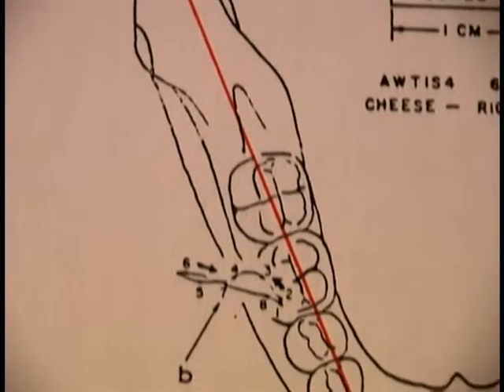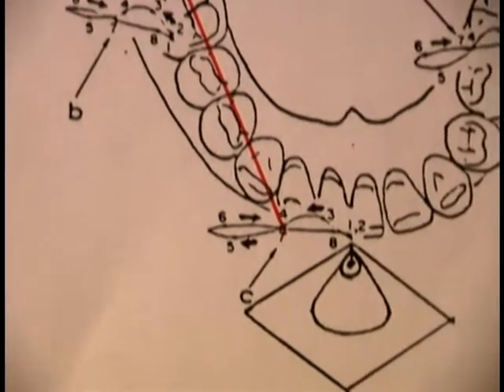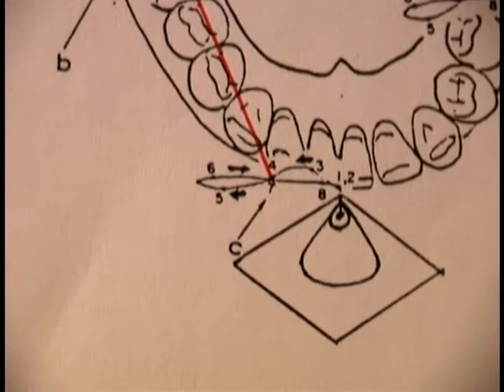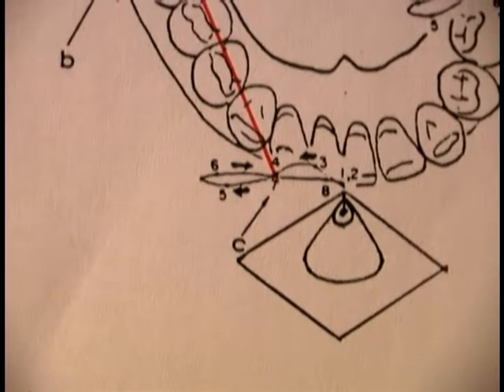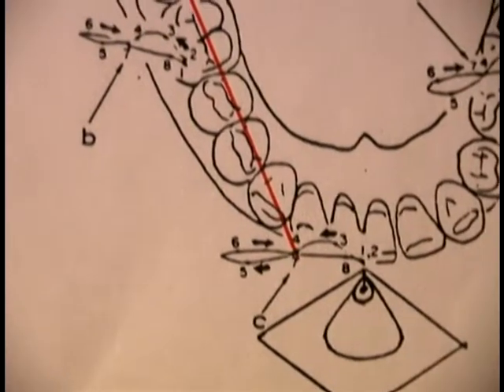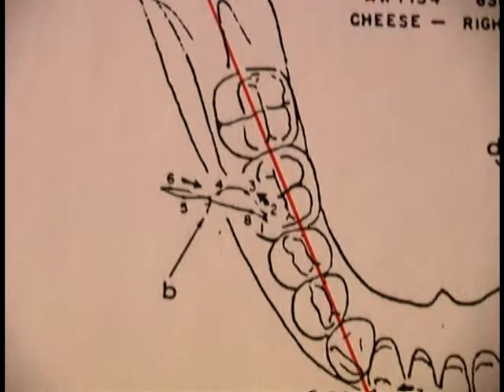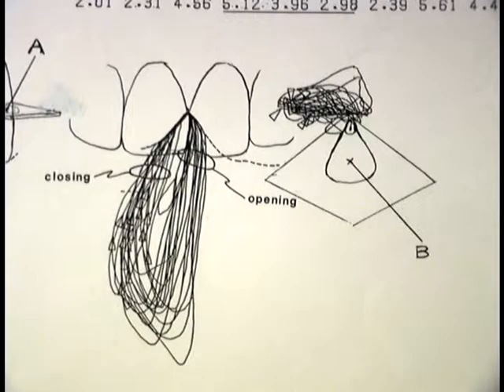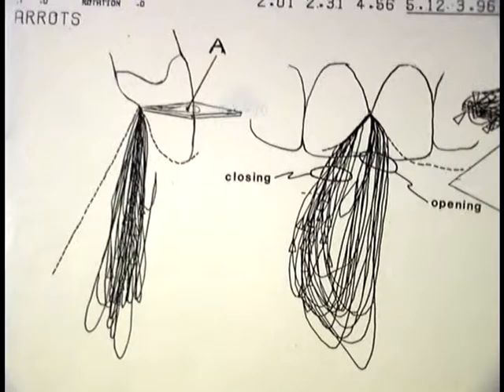The computer has placed the same numbered orientation timing dots on all of the plots to describe total jaw movement. The incisor closure is a direct medial movement through point 7 and 8 to point 1, while the molar's final closure is forward and medial in direction, passing through point 7 and 8 and ending in the intercuspal position. Multiple chewing plots in 3 planes again illustrates how the Gothic arch tracing gave a misleading picture of where chewing takes place.